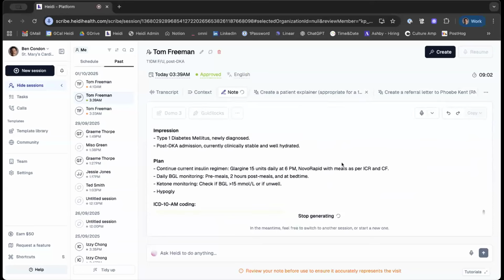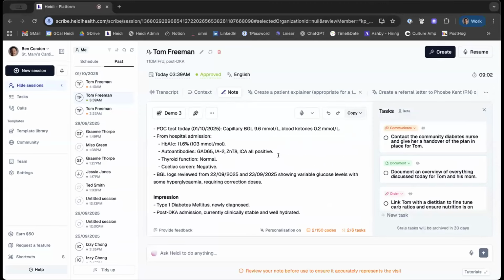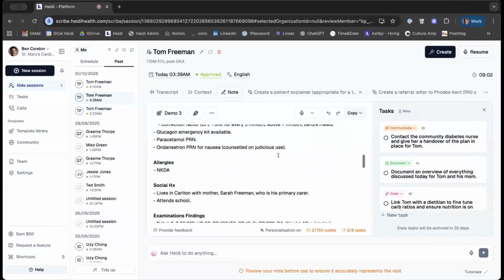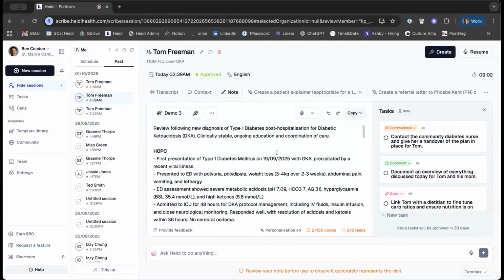You can add details around past tense, or not to add information in certain areas. For example, you could write for patient's clinical history: do not discuss anything that was discussed in today's appointment, only refer to previous medical history discussed in the context. Or you can be quite specific with how you manage timeframes in templates.